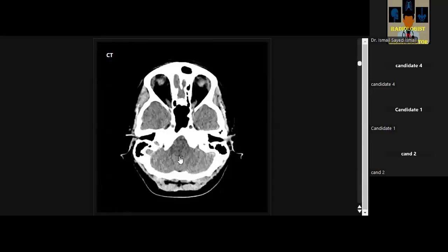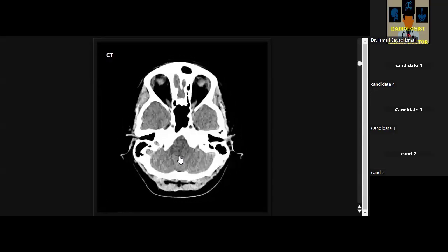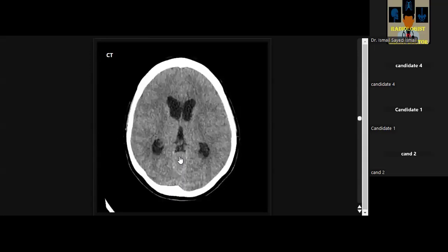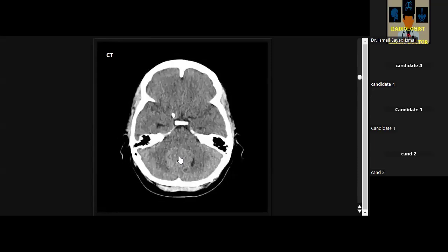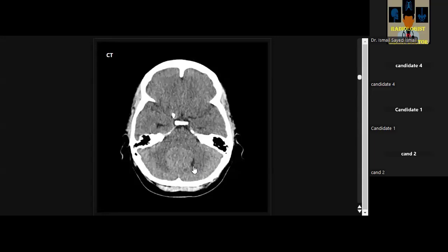Please, my friends, don't go forward and back to the same area. It leaves a bad impression, okay? So concentrate on this lesion and mention the importance of hydrocephalus, because this is considered a neurosurgical emergency. We have 3 neurosurgical emergencies with the letter H: hydrocephalus, hemorrhage, and brain herniation, like tonsillar herniation in this case.